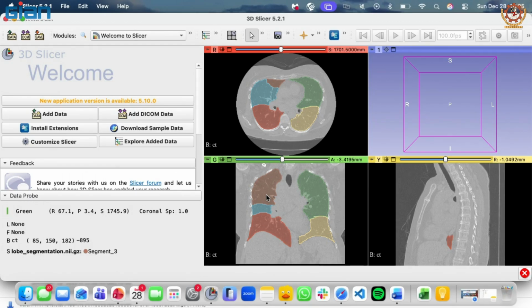So, reiterating again, you'll have to upload the ct.nii.gz, not the ts underscore ct. Yeah, I think I should have kept that brats underscore 00000 name. I just simplified it to ct and mr, and that creates a problem.